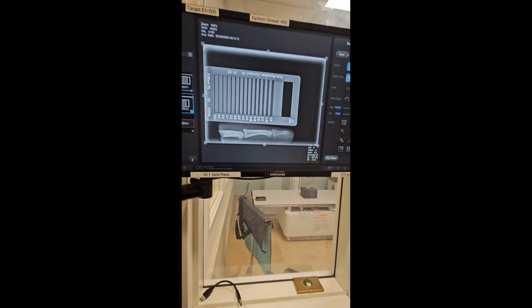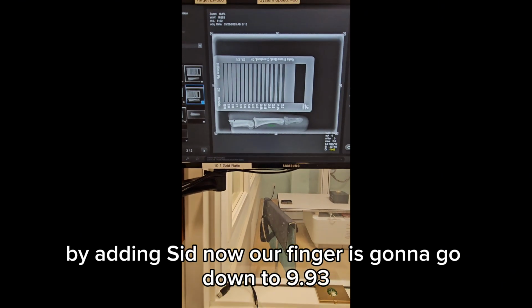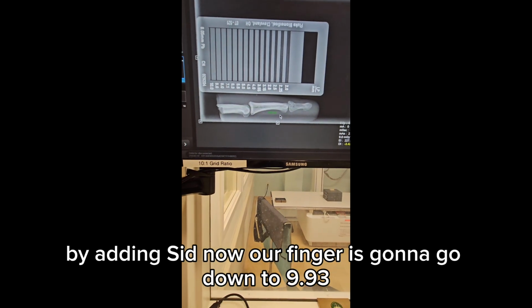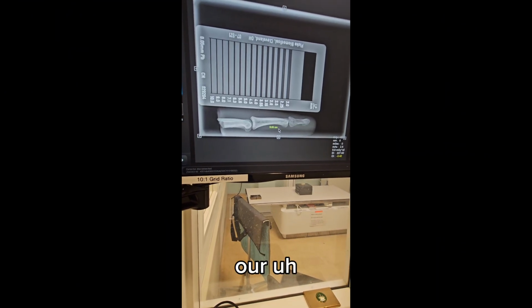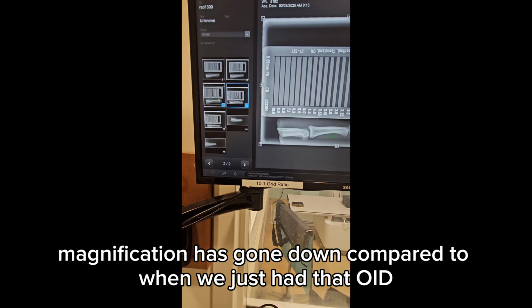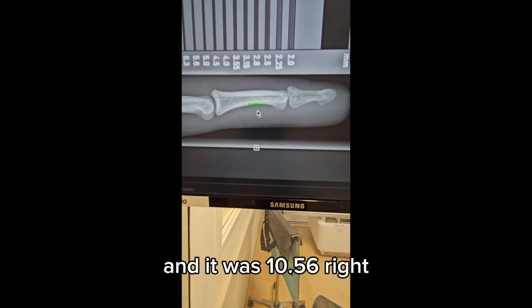Okay. Remember our last picture had a magnification factor of, okay, I totally knew what I was talking about. By adding SID, now our finger is going to go down to 9.93, meaning that our magnification has gone down compared to when we just had that OID, and it was 10.56, right?